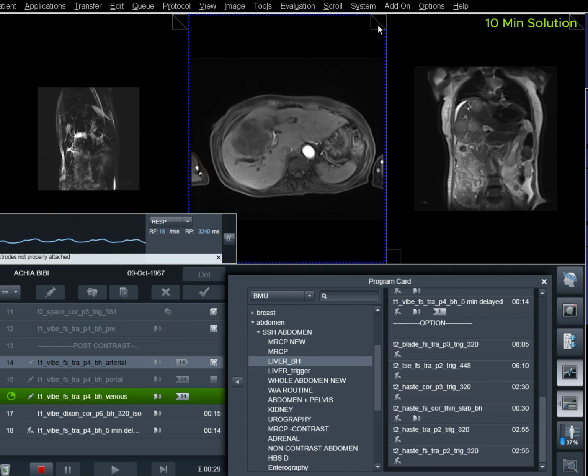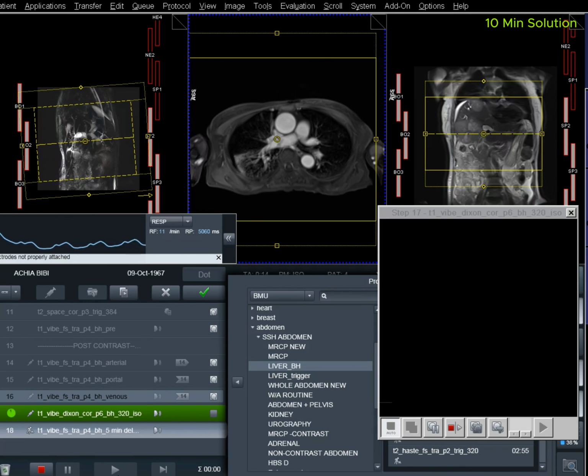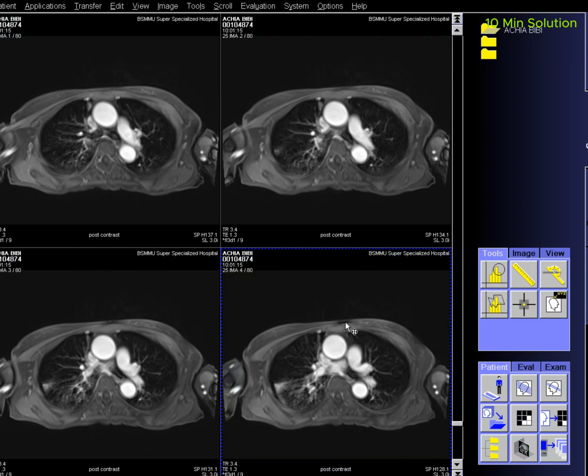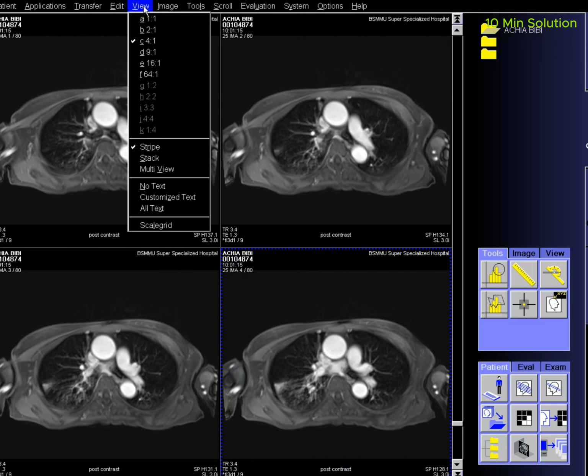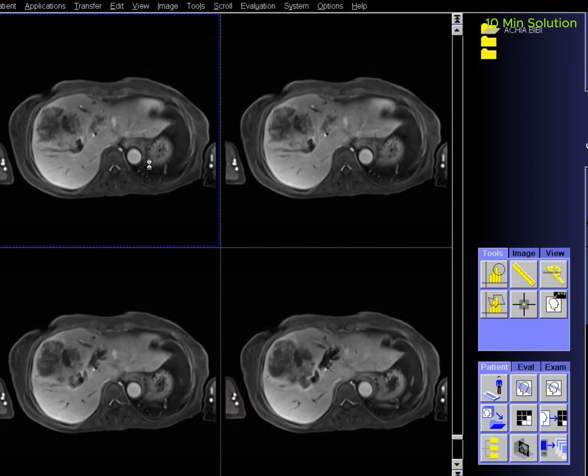Contrast administration and timing of scans. Guess timing technique. This is one of the simplest methods. It works by estimating the time it takes for contrast to travel from the site of injection to the vascular structures of the liver. This technique is highly dependent on factors such as the site of contrast injection, patient's age, cardiac output, and vascular anatomy.